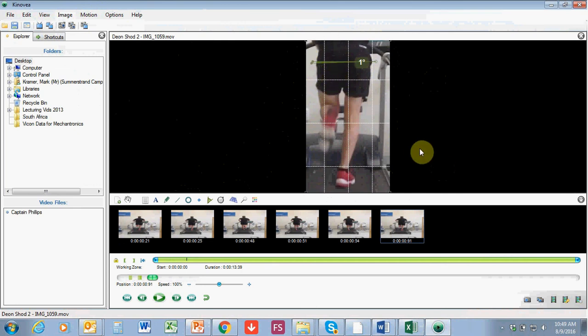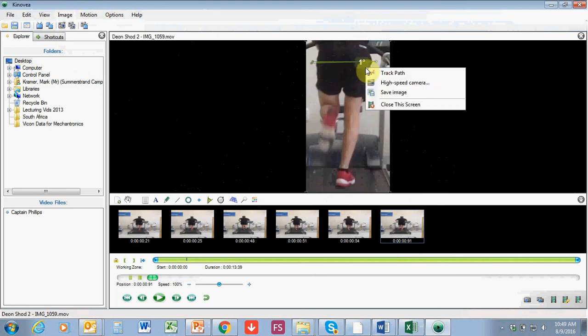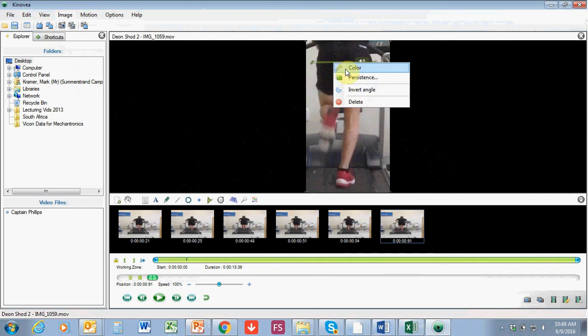Okay, so again, I would screen capture that, make a note of it, and use it in the reports. For now, I can delete this, and delete this as well.